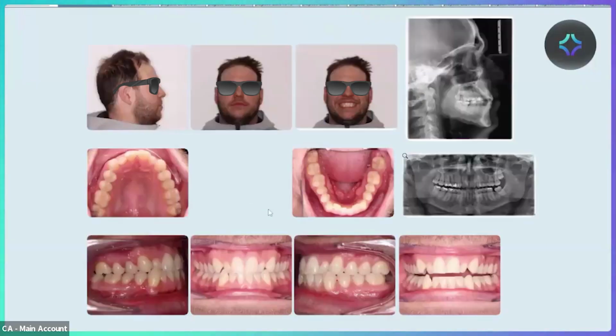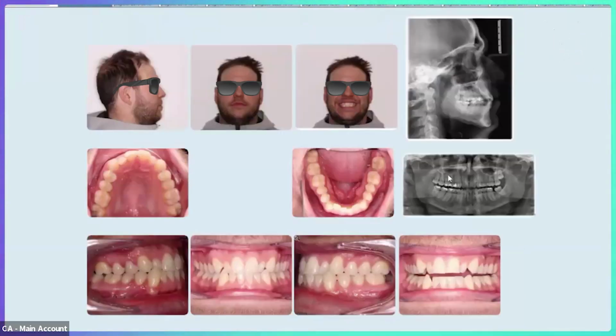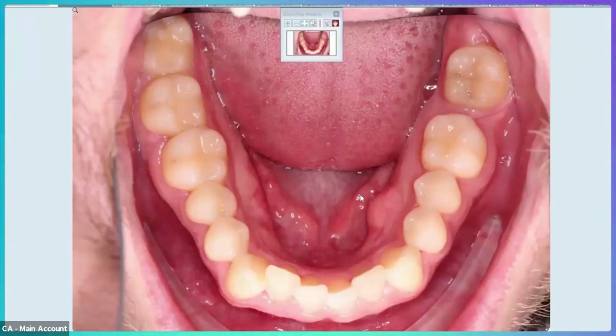Now you could go ahead and leave this space because right now the tooth is in some occlusion and the space is large enough that it is hygienic between that tooth and the one in front. There is definitely a time and place for leaving spaces between wisdom teeth that have drifted and the first molars. But in this situation, it's so tantalizingly close that we do choose to close the space.